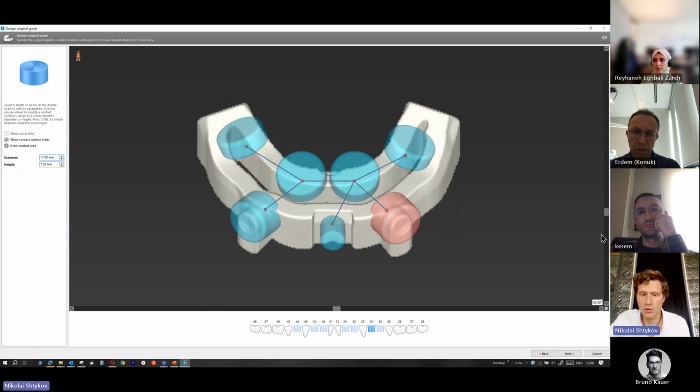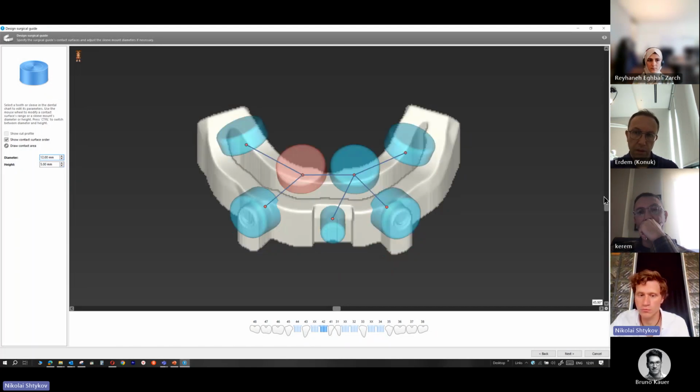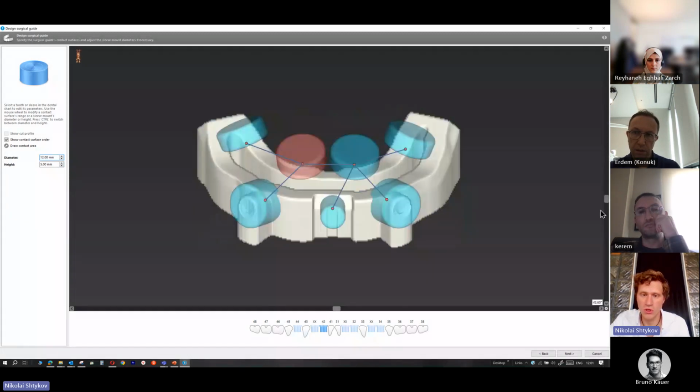Maybe this pin, not this. I want to use it like this.